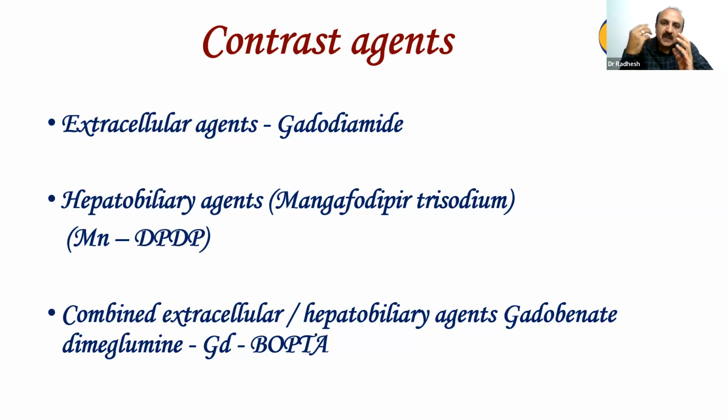Now I am reducing that value further by using a paramagnetic substance, which is gadolinium. So how does gadolinium look on MR? White. Absolutely. It looks white because on MR, when we use gadolinium, which is a paramagnetic substance, it reduces the T1. Once the T1 is reduced, the whole thing starts looking white. Be it the aorta, portal vein, hepatic vein, IVC, or any vessel, it starts looking white on contrast. That is why you use gadolinium.